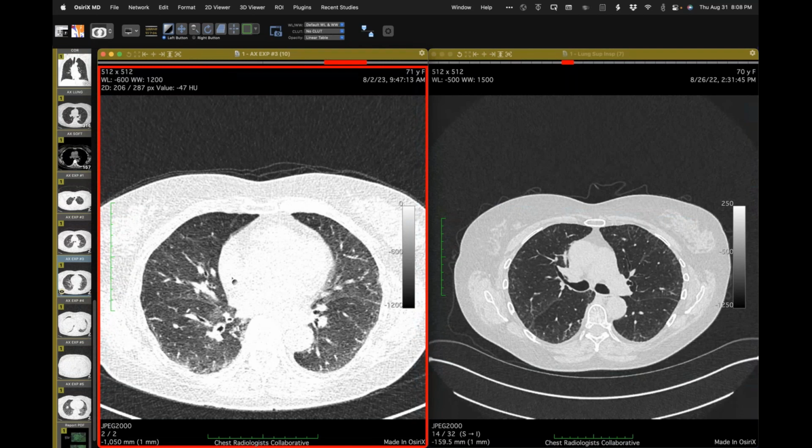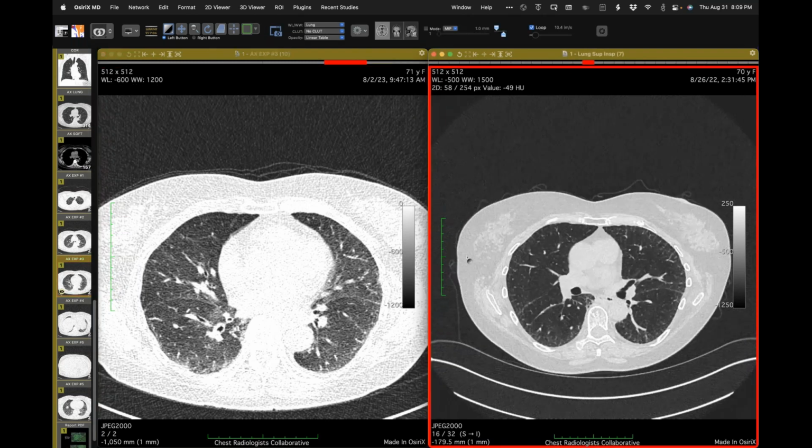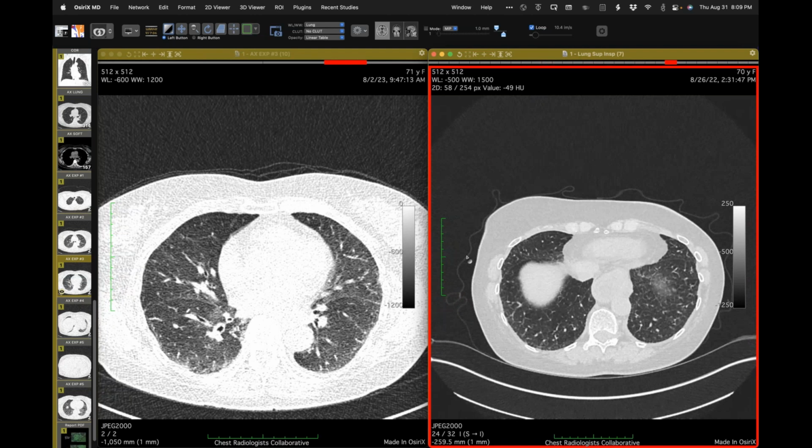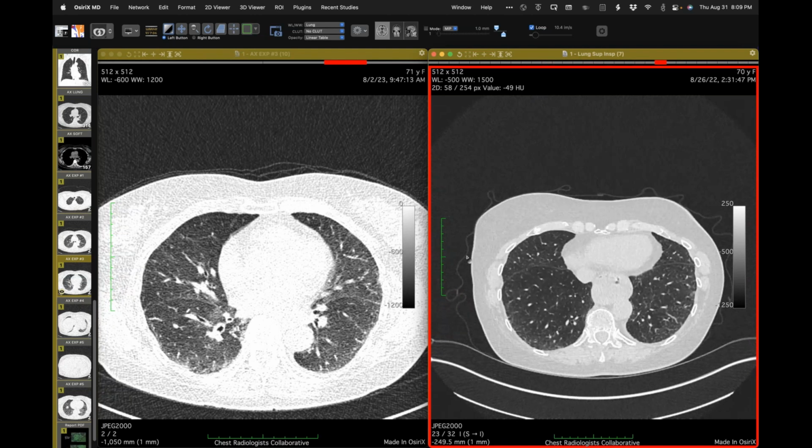So I would not be able to make a diagnosis. I would just describe this as unclassifiable, certainly by virtue of the absence of subpleural traction bronchiectasis and honeycombing, or even traction bronchiectasis. I wouldn't be thinking of UIP particularly, but if anyone thinks this pattern is suggestive of a particular entity, certainly say so, but I would simply describe it as abnormal, unclassifiable, and really that's it.